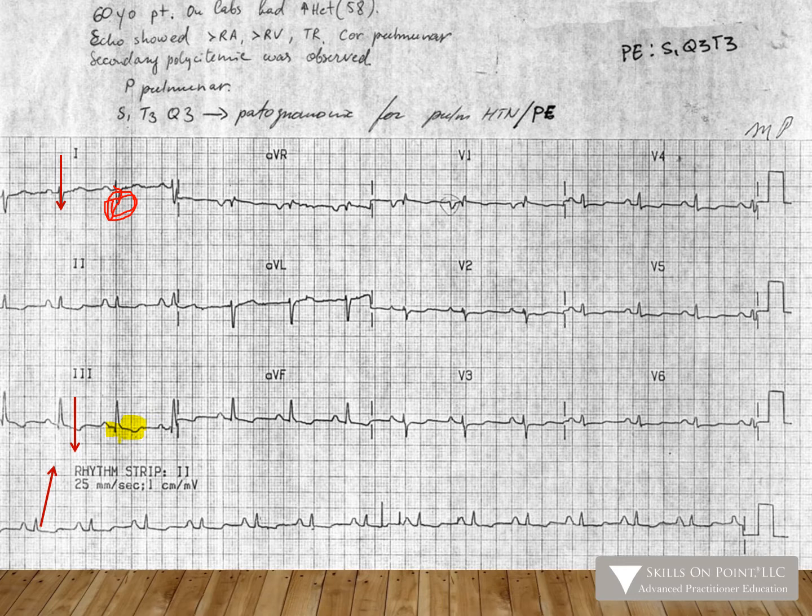So the rest of the EKG is fairly benign. You go, it doesn't make sense. They're having chest pain, everything's awful, and then you don't see anything else, but you do see that. You go, wait a second, time out. I have something going on here. This is legit. So always keep this as an index of suspicion. Now, this guy also has a little bit of depression in lead 2, and then also over in AVF. So the entire inferior system, which is fed by the RCA, is being taxed right now. Not good.